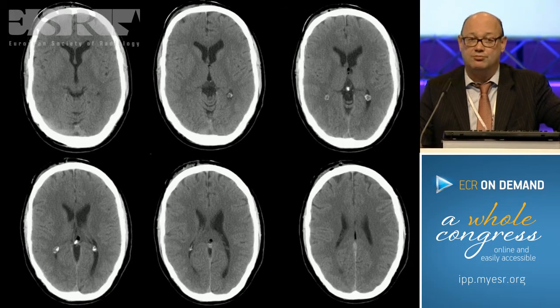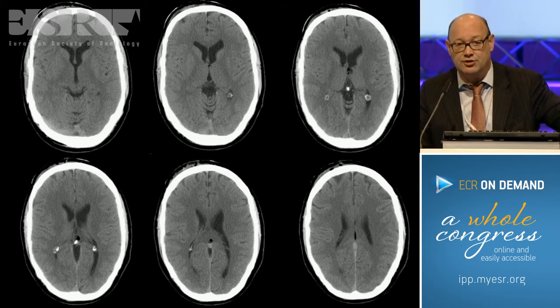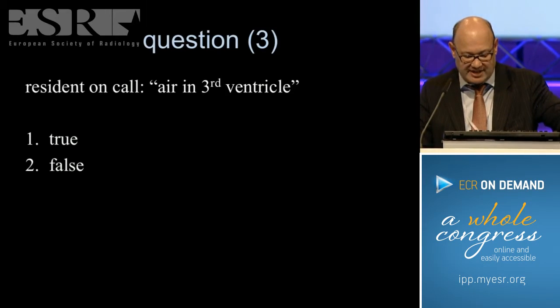I was called by the resident in training. He said, Dr. van den Hauwe, can you have a look at this study, because I cannot explain why there is air in the third ventricle. How can we explain there is air in the third ventricle? Do you think that the abnormality that you see, air in the third ventricle, is a correct statement or is it not?